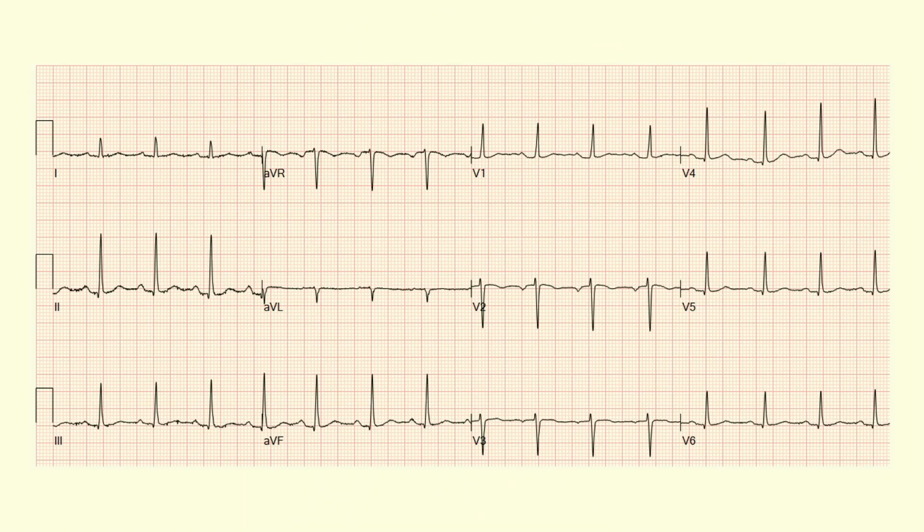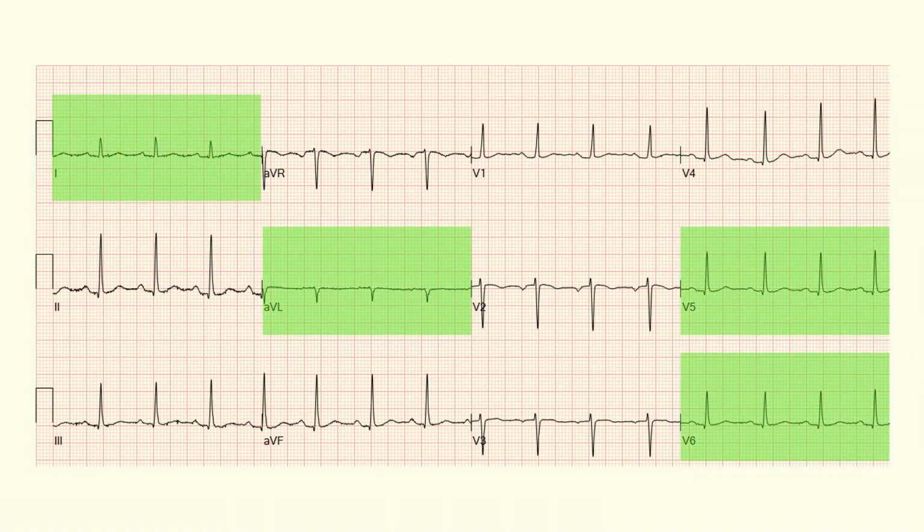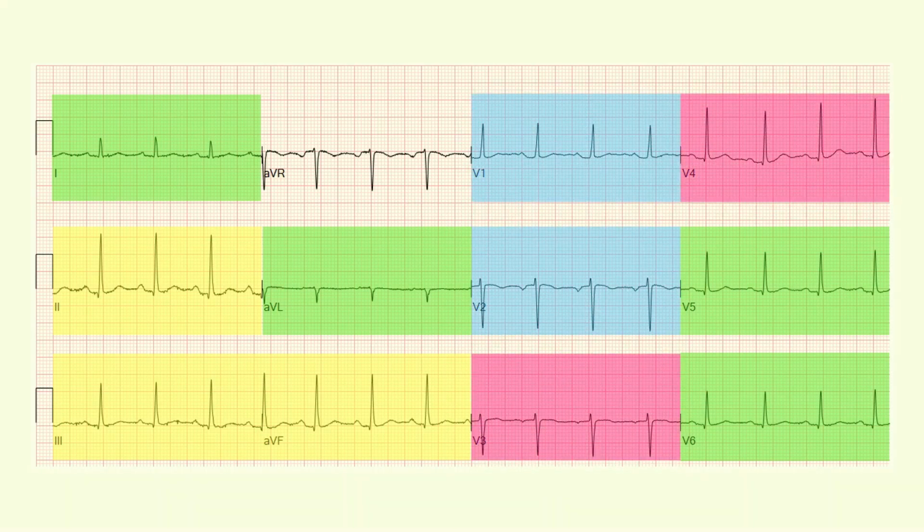and I'll move on. And then someone thought, we need to put this in a way that makes a lot of sense on the ECG. Let's group everything, oh, yikes. So, not the best, but we learn to live with it. There are other formats of the ECG that make a little bit more spatial sense. There's something called Cabrera format, which is more of a clockwise representation, but we got what we got. This is North American, where it's probably not going to change.